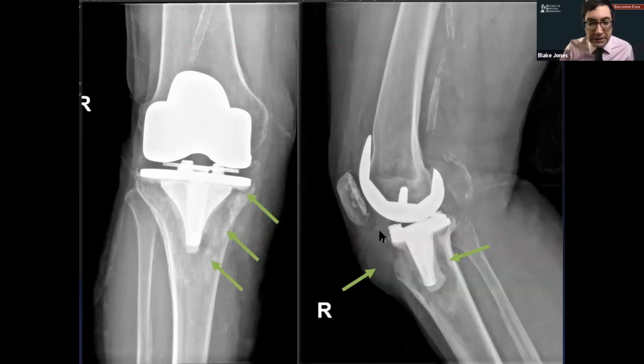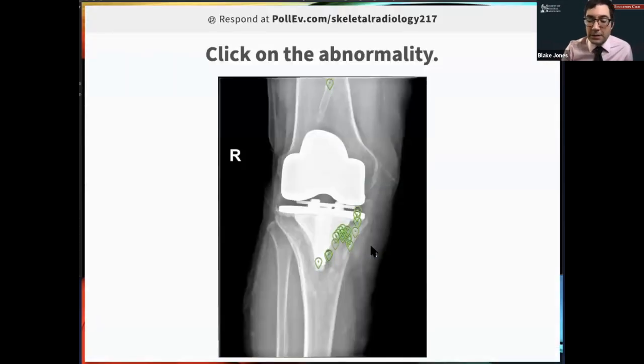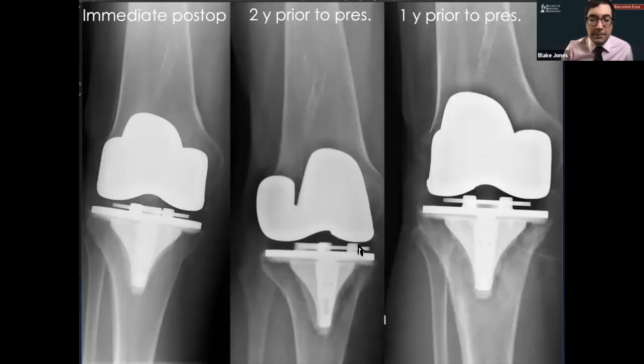I don't think it really did. I think it's really hard to show any osteoid matrix. Maybe some of these little blobs in here were some osteoid, though on this screen it's not the best either. And yeah, I think it would definitely be reasonable to have suggested it at that time.